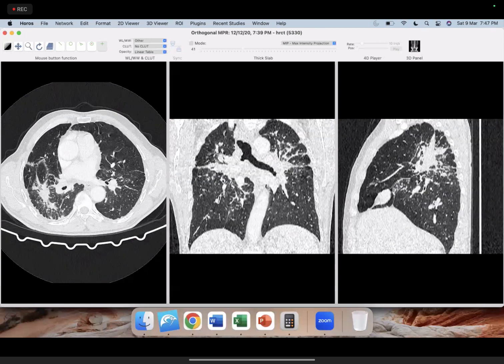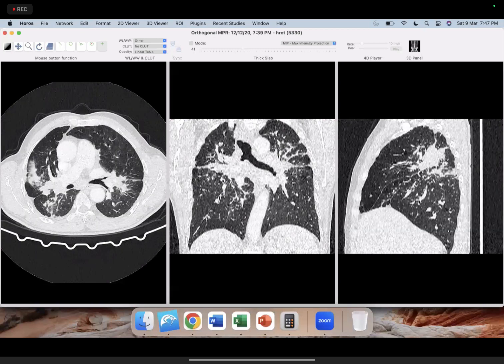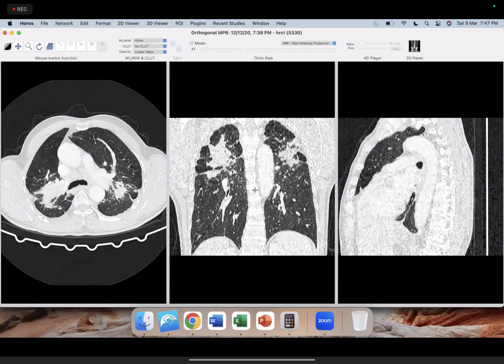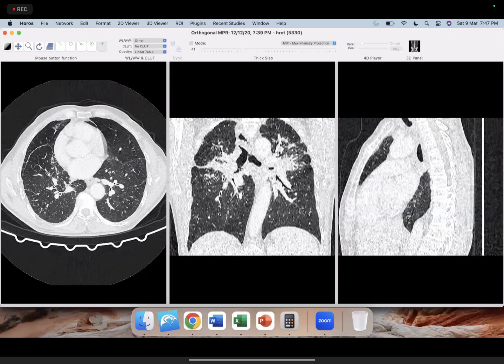So this is one such time where you will think of one particular condition, and again you need some history also that we will come to, and then you know what this can be. So many times these are mislabeled as either superadded infection like pneumonia, where they label consolidation, or many times you can even label these as masses and ask for biopsy to rule out malignancy. But this is nothing but this patient. Once you see this type of high density randomly distributed nodules with even lymph nodes like this, some of them may show eggshell calcification also, then you ask the patient for silica exposure history.